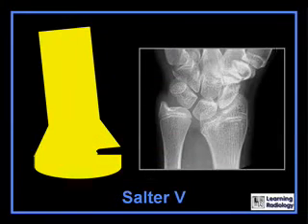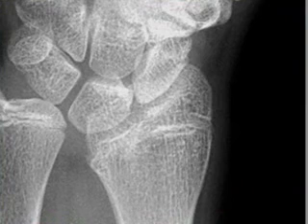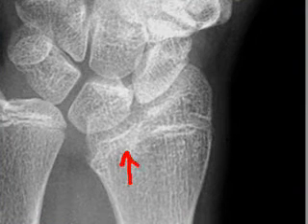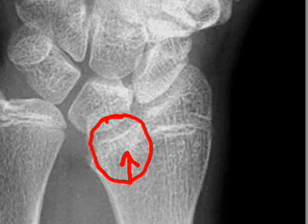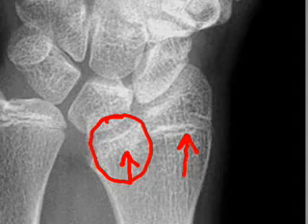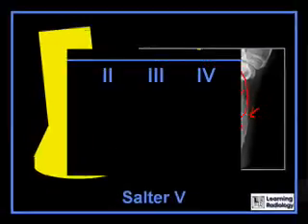And here's an example of that in the distal radius. On the medial side of the junction between the epiphysis and the metaphysis, there is fusion. On the lateral aspect of the epiphyseal plate, the plate remains open, and that has resulted in an angular deformity because growth stopped medially while it continued laterally.